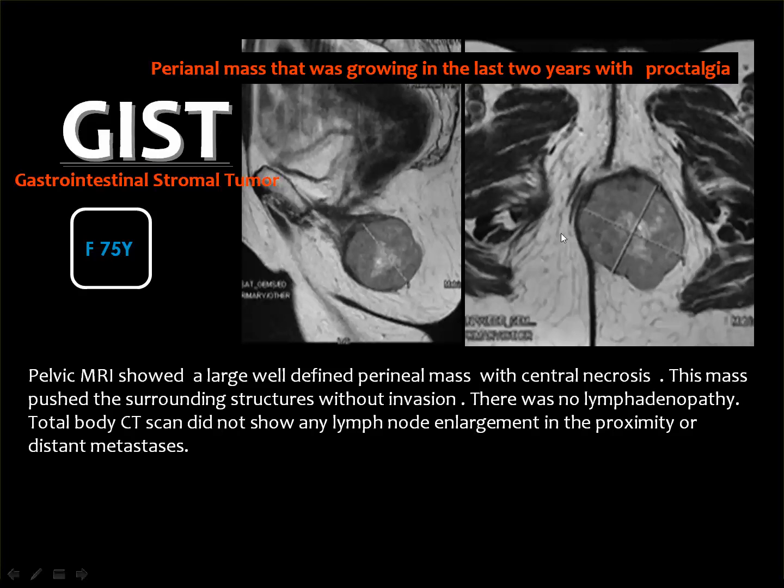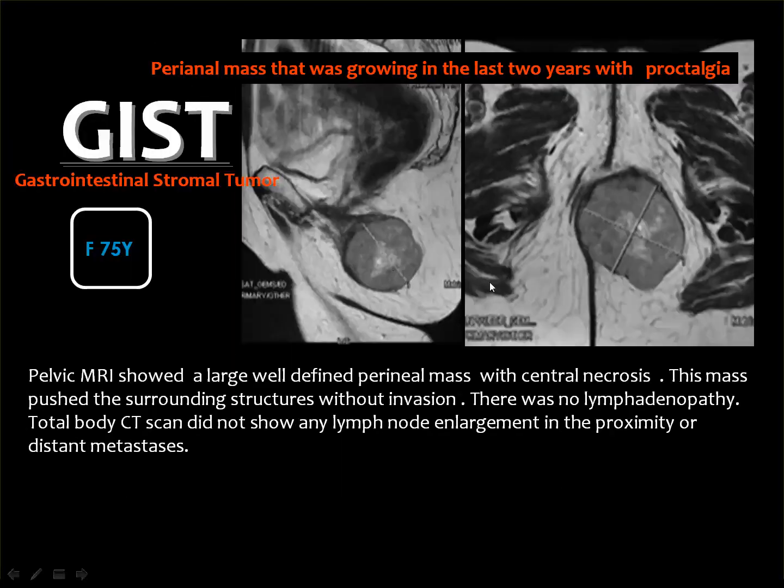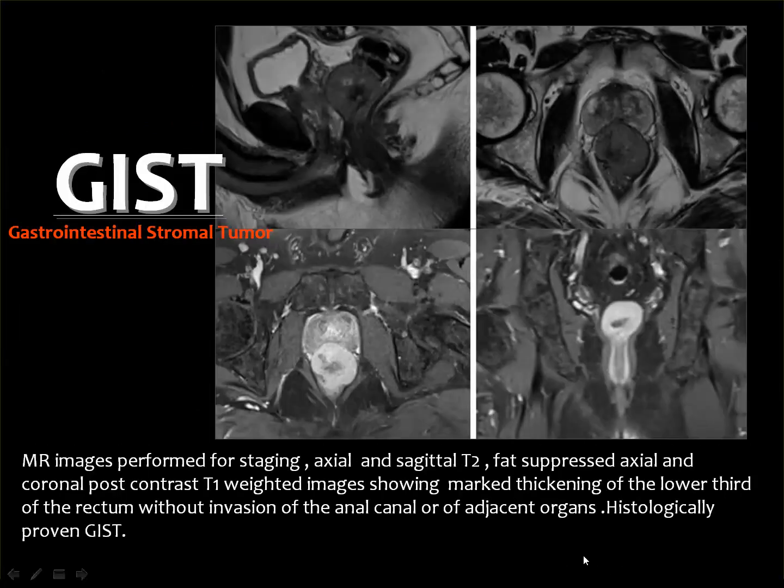And here is an example of a gastrointestinal stromal tumor in the anal area with minute areas of breaking down because the tumor is sizable, as you can see. Another example of a big bulboid lesion in the anal area with a smooth surface and almost homogeneous signal intensity.